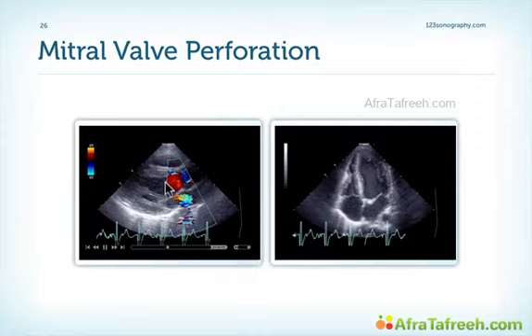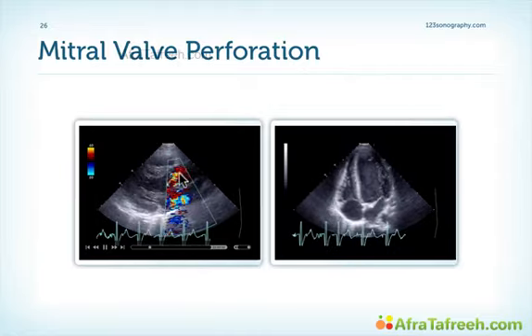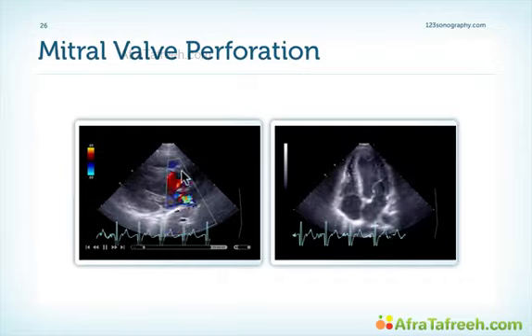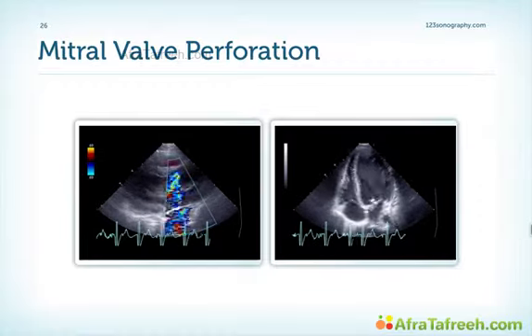One side comment: why does the patient actually have a perforation? Well, he had endocarditis, but not of the mitral valve, rather primarily of the aortic valve. What happened was that infectious material was carried to the anterior leaflet because the patient also has aortic regurgitation, and thereby we had secondary involvement of the anterior leaflet. The patient developed an aneurysm here and a destructed anterior leaflet, and finally the leaflet perforated.